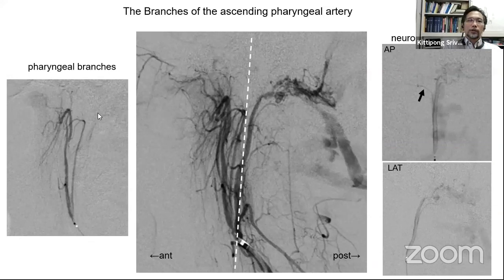You can have the arteries that mainly supply the soft tissue, but it's not really only the soft tissue. Actually, this will have dangerous connections to the internal carotid artery system also, and also the internal maxillary artery. As I've told you, it has a vast range of anastomosis. And the posterior one, this one will be what we call the neuromeningeal trunk.